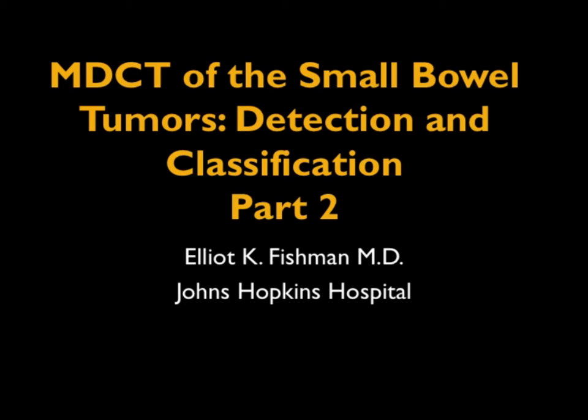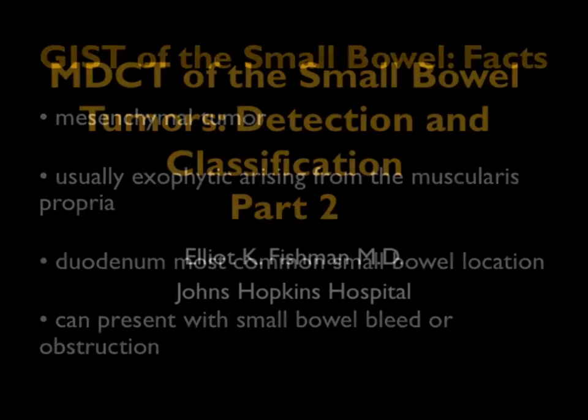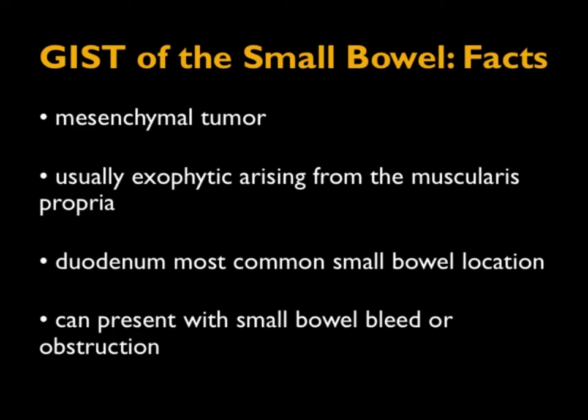And we spoke a little bit about technique before, or a lot about technique, and I went into details about adenocarcinoma and carcinoid tumors. And now let's look at GIST tumors. GIST tumors are really interesting. They're mesenchymal tumors, and it is one of the tumors that we see more frequently now. They can be small, and when they're small, they're often very vascular and they bleed. They can intussuscept, and they can be large and necrotic.